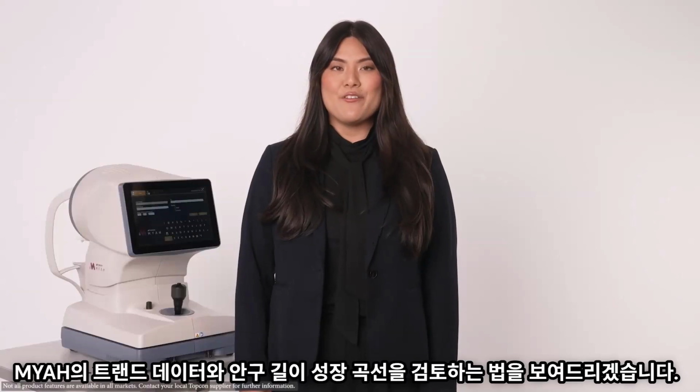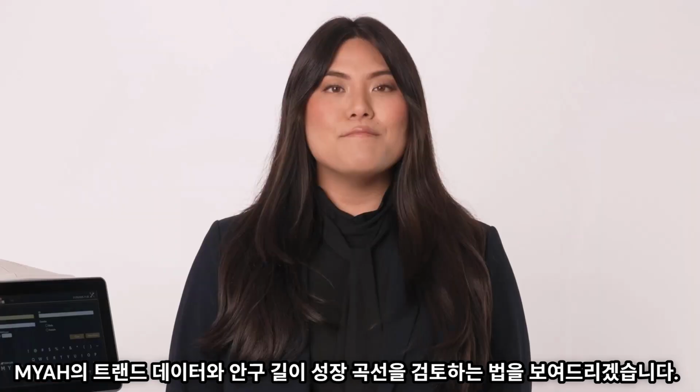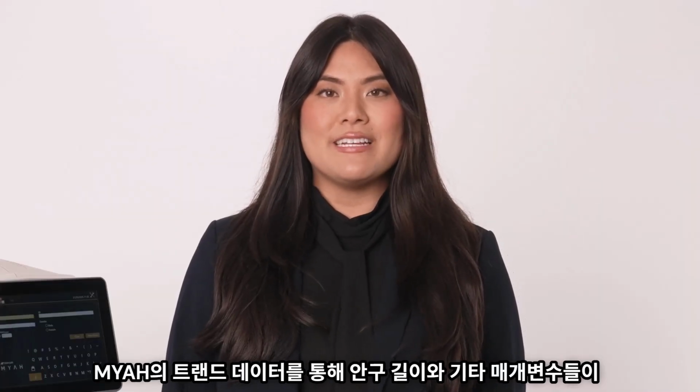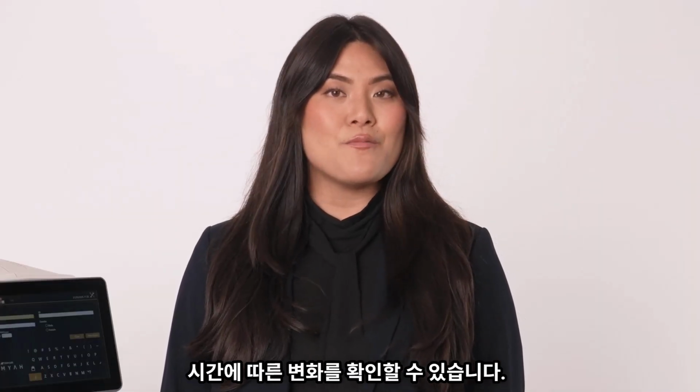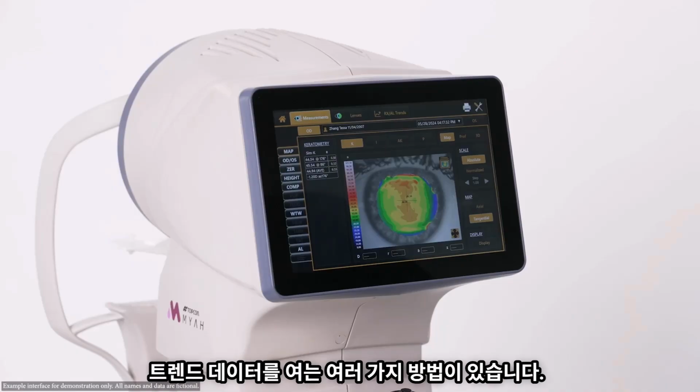Let me show you how to review trend data and axial length growth curves on the Myah. Myah's trend data allows you to examine how axial length and other parameters are changing over time. There are a number of ways you can access trend data.